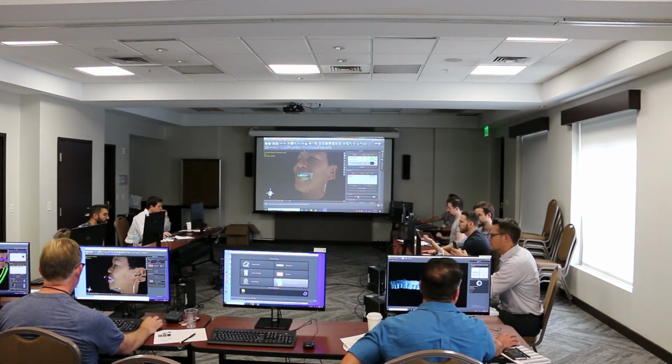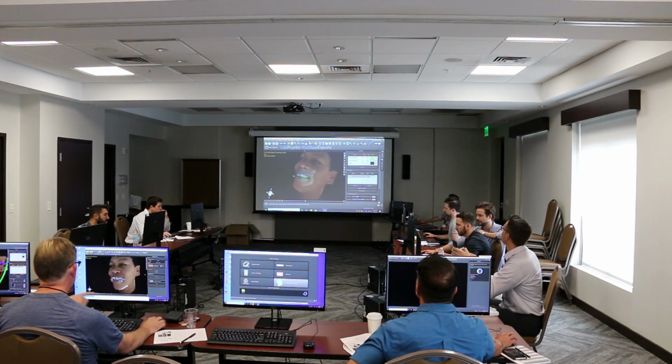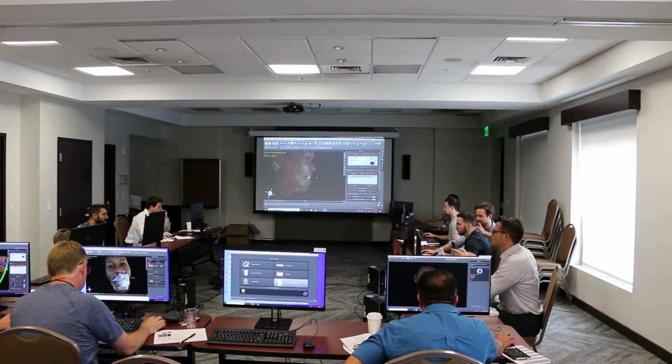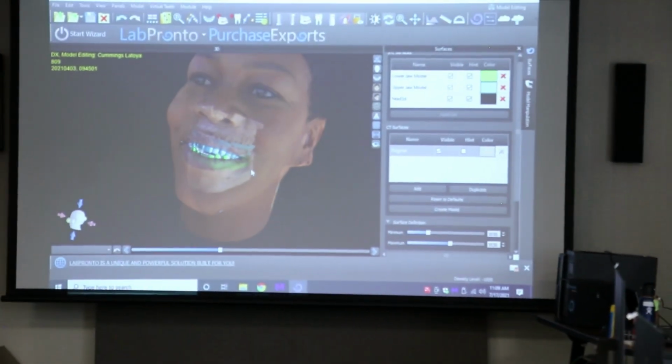And one of my favorite things is here to turn on these different surfaces. Now I get it, okay. You see how I made her face transparent? You have to go to this lower bar and drag this over this way, showing the lips. This one's important too. That's the lips in the scan. So just move the line and shift click it.